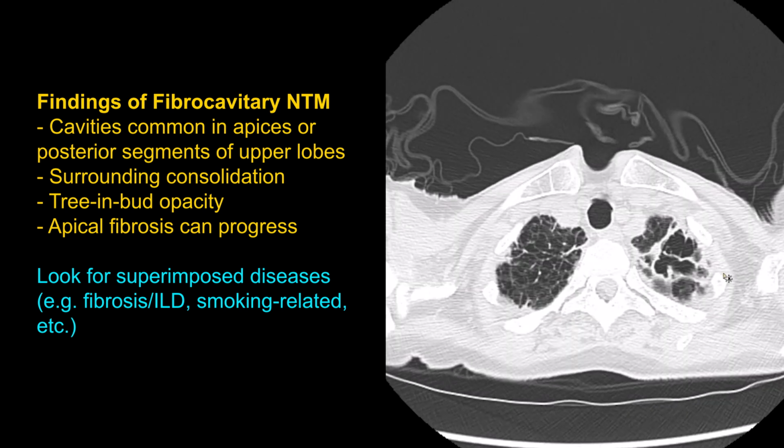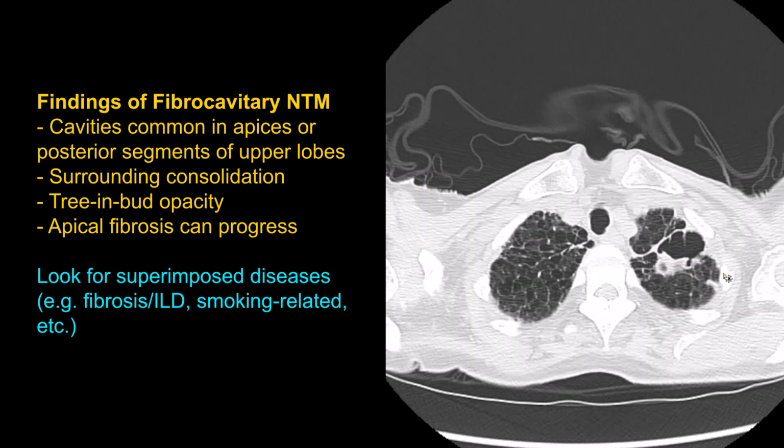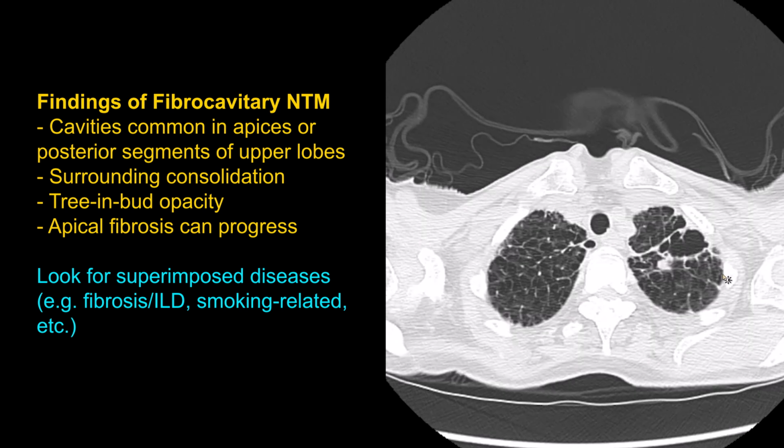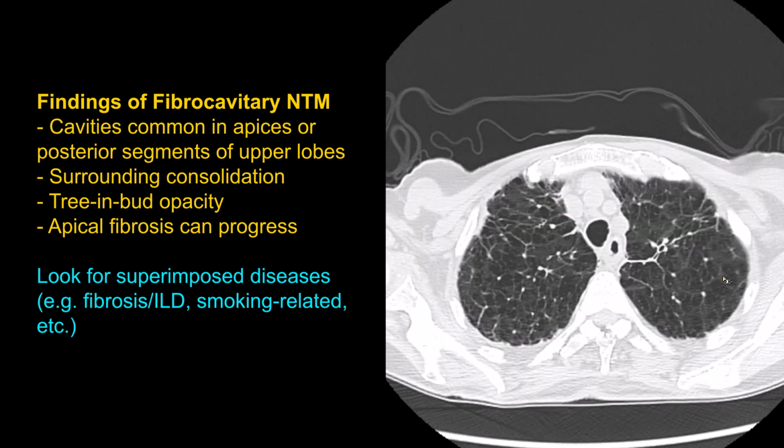These patients with the fibrocavitary form of NTM present differently. They have greater morbidity, and they're also treated differently. So it's important in your report to mention the cavities and mention that this is the fibrocavitary form of Nontuberculous Mycobacterium. Here's another patient with the fibrocavitary form of NTM.